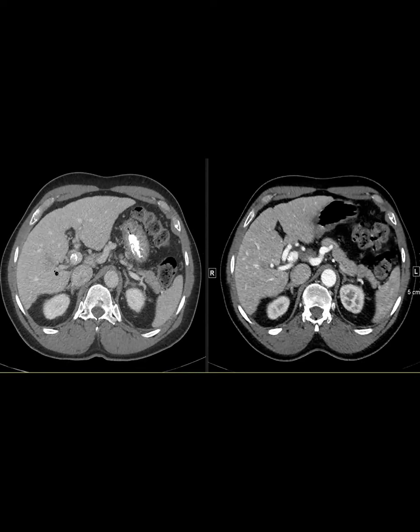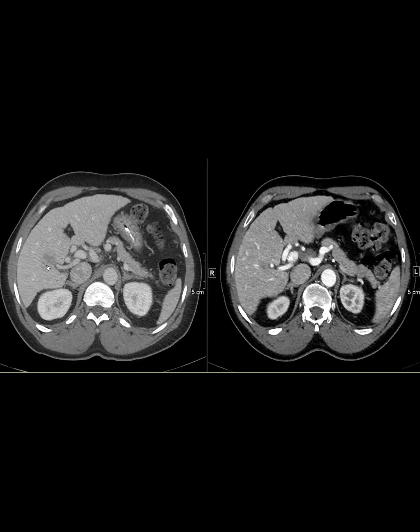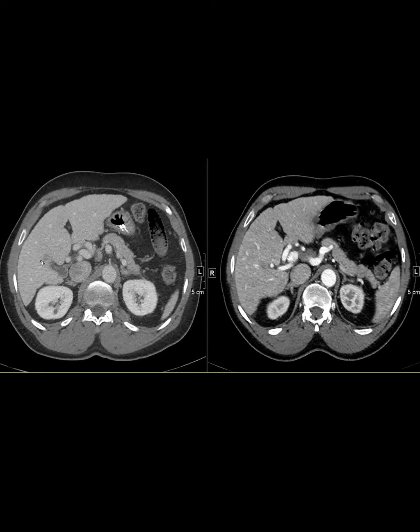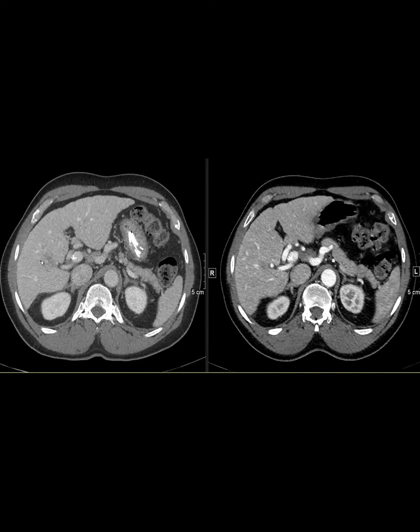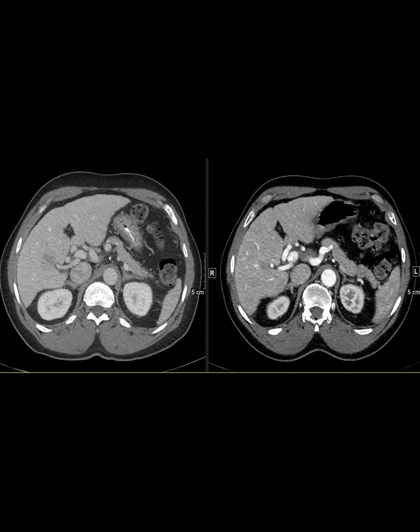Potentially, if I was very astute that day, I could have said, okay, this is something more infiltrative, and if you have something infiltrative without tumor in vein, that goes into the LR-M category. But chances are I probably would have called LR3.